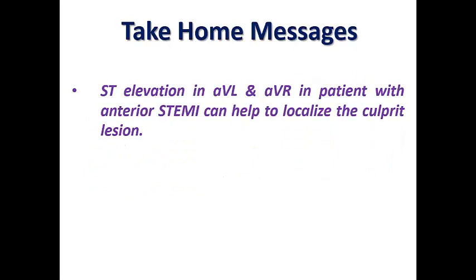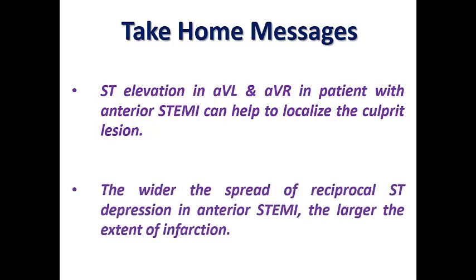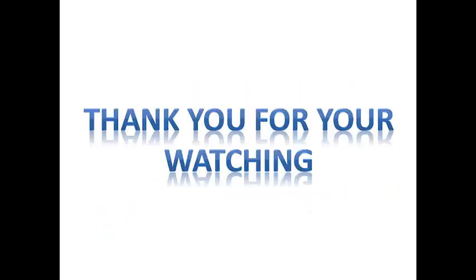And our take-home message today: ST elevation in AVL and AVR in patients with anterior STEMI helps to localize the culprit lesion in the majority of cases. And the wider the spread of reciprocal ST depression in anterior STEMI, as in inferior leads or AVR, the larger the extent of infarction.